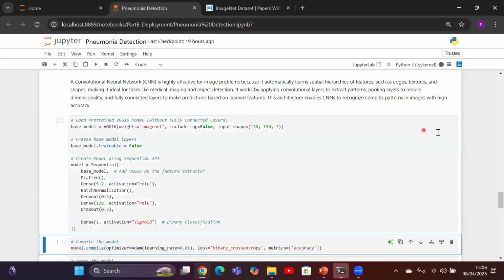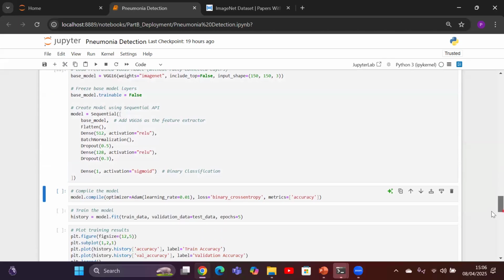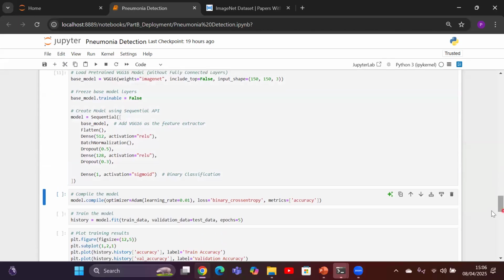Again, I'm going to run this model, considering the base model is a VGG16 trained on the ImageNet library, and I'm modifying the base model based upon my requirement, because my data does not belong to the ImageNet data, but is something different: chest X-ray images to detect whether pneumonia is present or not. I hope this is again clear.